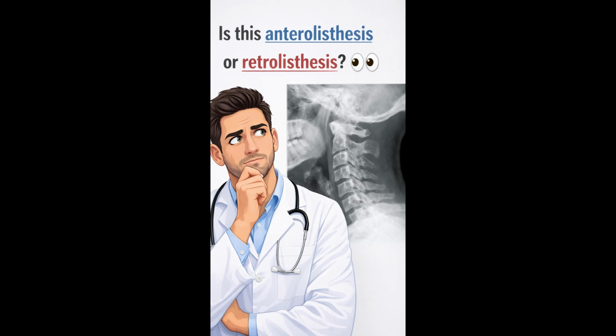Whenever we are handed over an X-ray of the spine and we see some shift in the vertebrae, we always wonder whether that shift can be called anterolisthesis or retrolisthesis. In this video, let's discuss step by step how we diagnose the shift to be antero or retrolisthesis.